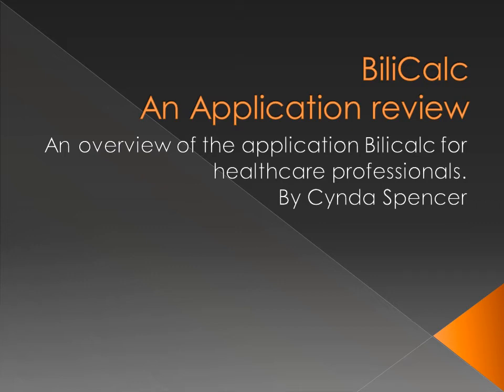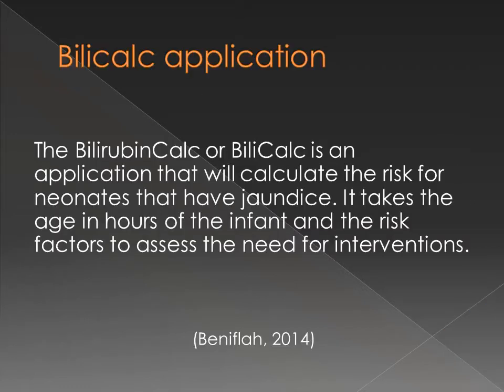This is an overview of the application BiliCalc. BiliCalc is an application that will calculate the risk for neonates that have jaundice. It takes the age and hours of the infant and the risk factors to assess the need for intervention.